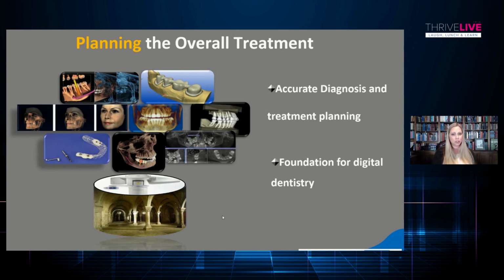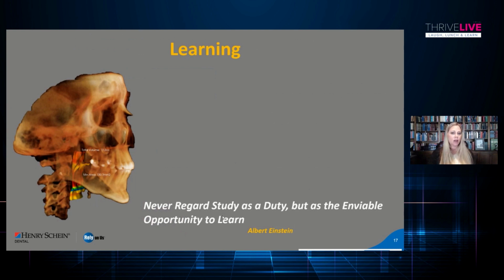But again, if you can dream it, somebody can code that for you, and you can pretty much do anything you want to with this amazing technology. It's also fantastic for your patient education. So this is really ideal for being able to show Mrs. Jones exactly what it is that we're looking at.